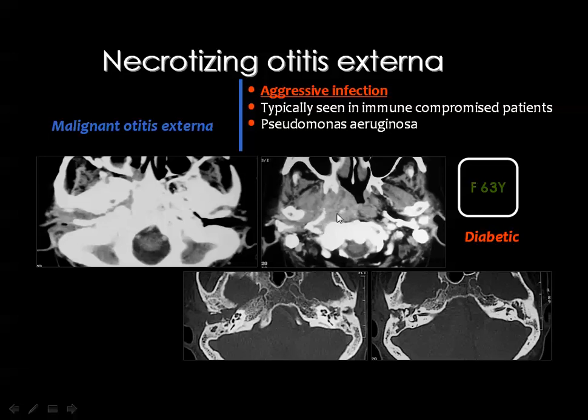In the parapharyngeal area, you can see that there is also inflammatory granulation tissue involving the pterygoid muscles, involving the wall of the nasopharynx, and extending into the infratemporal fossa. It is also seen spreading into the region of the temporomandibular joint on the right side. The bone window image at a higher level showed that the middle ear cavity is also involved by inflammatory material with bone erosions, but the ossicles are more or less intact.